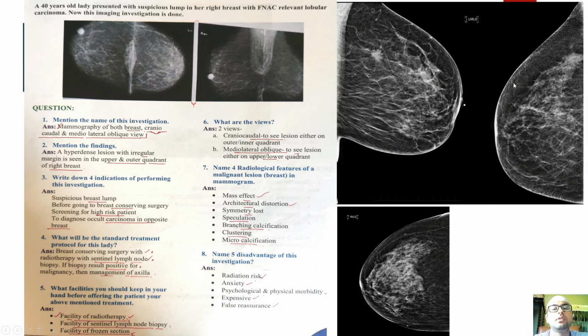So firstly, mammogram. You can see this is the mammography film. This is the breast mammography, and you can see some vascularity and some puckering, whitish areas and some white lesions here. These are the lesions. This is the breast tissue. Okay. So here you can see some radio-opaque shadows, and the radio-opacity is more.